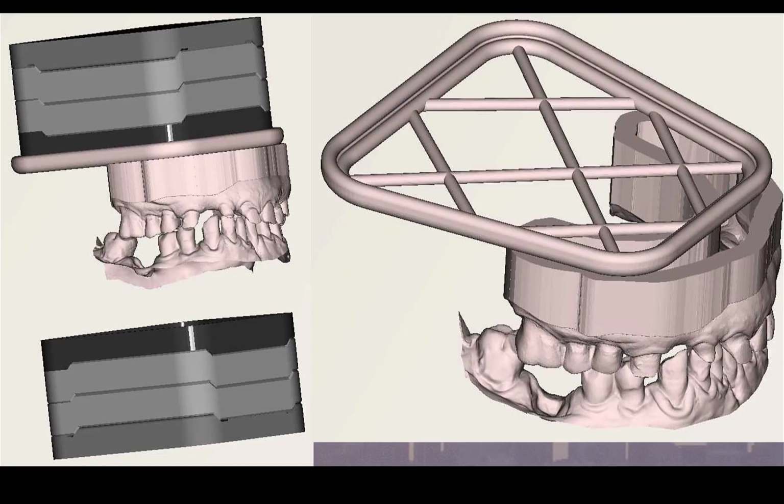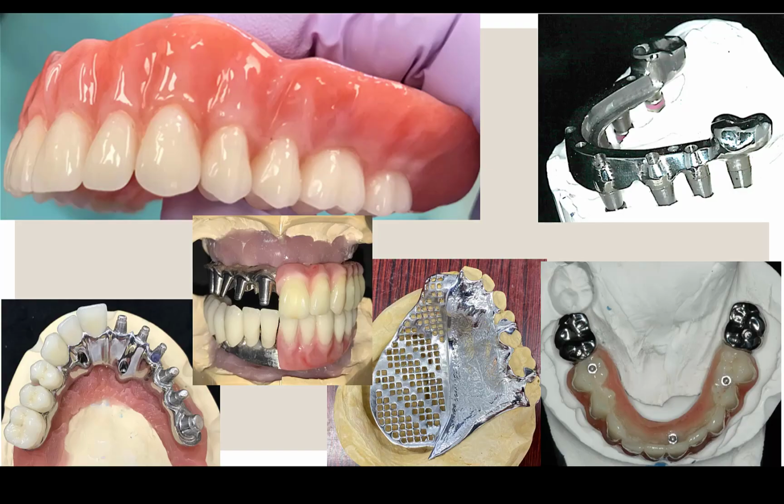There's even model building software within PDC that allows you to reuse spacer discs and stack them to affix a hollow model. This saves resin, gypsum, and time. Even if you have intraoral scans, you can still mount them on an articulator if desired.